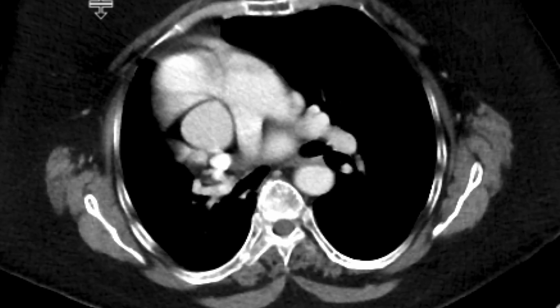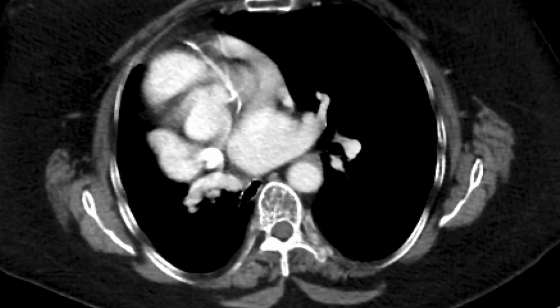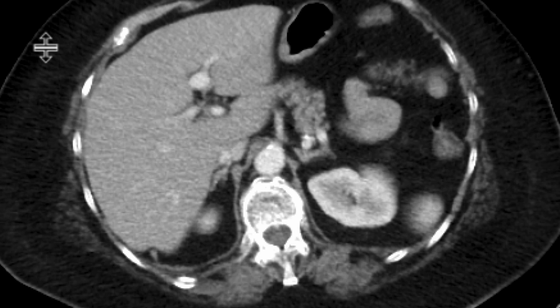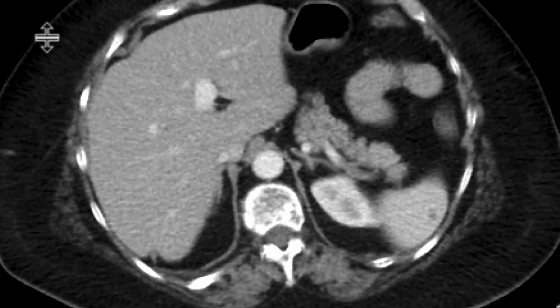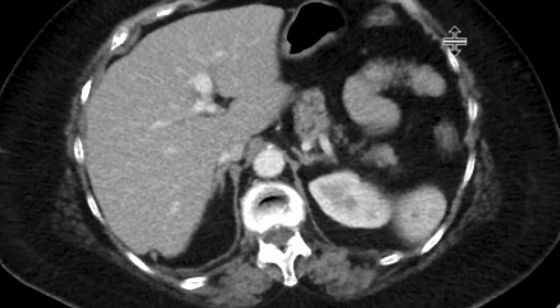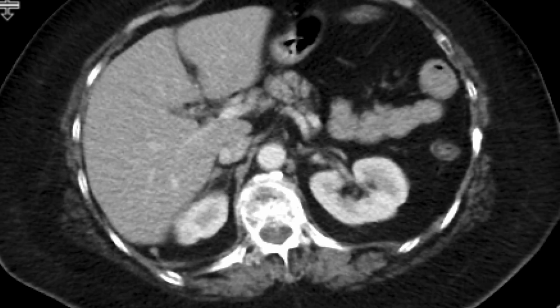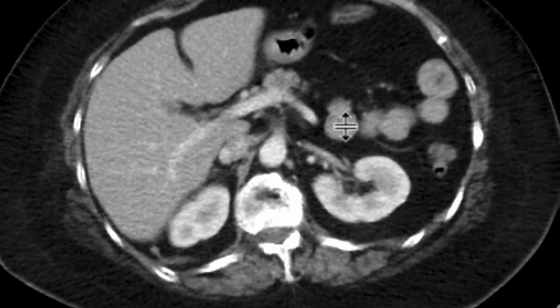In this instance, when we look back on a prior study a little while ago on the same patient when they did not have abdominal pain, we can notice that in some of the same loops of small bowel in the left upper quadrant, there's almost this sort of lobulated mass-like lesion associated. For example, with this loop, if we just focus on this area here, there's sort of a mass on the undersurface of it. There's also a similar appearing mass on other portions of those loops of jejunum right over there.